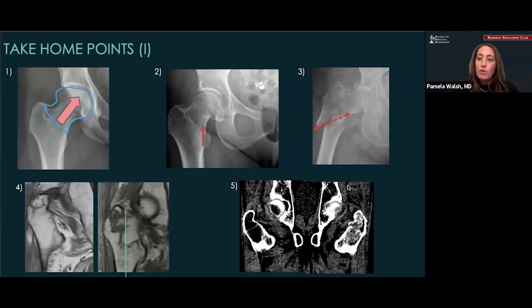We looked at how to identify these fractures, especially when they're subtle, to trace our cortices. It's important to describe displacement on our orthogonal views, and when it's more obvious on our frontal views. We looked at intertrochanteric fractures and specifically reverse obliquity fractures, how that's important because those fractures are unstable. So it's really important to look for the course of the fracture, and if it's reverse obliquity, to mention that in your report because that does change management.